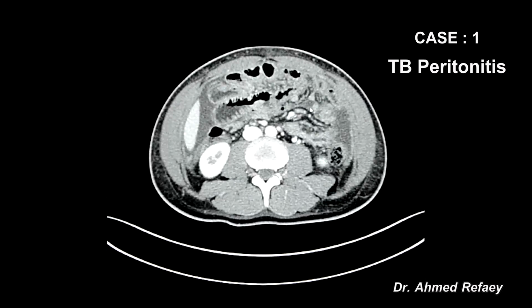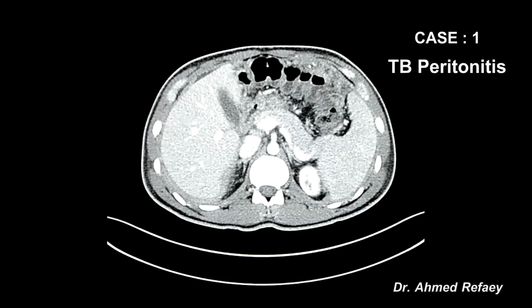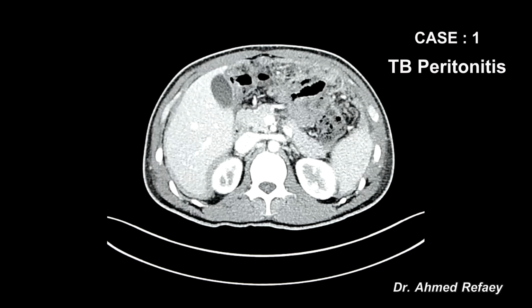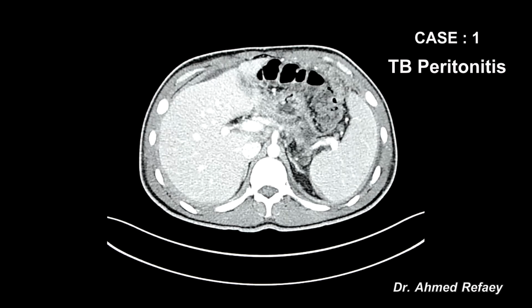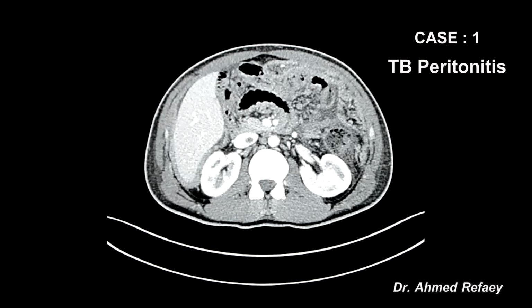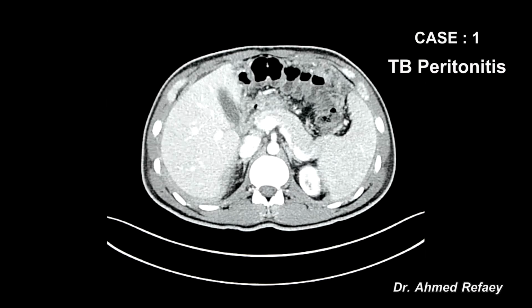And here in the region of the mid-abdomen, this is the transverse colon. Anterior to the transverse colon and under the anterior abdominal wall, we have the omental cake. So this is the omental cake, the sign of our episode today. Omental cake is seen in the form of thickening and nodularity of the greater omentum anterior to the transverse colon and just underneath the anterior abdominal wall, as you see here. So all of this is thickening and nodularity of the omentum, or omental cake.